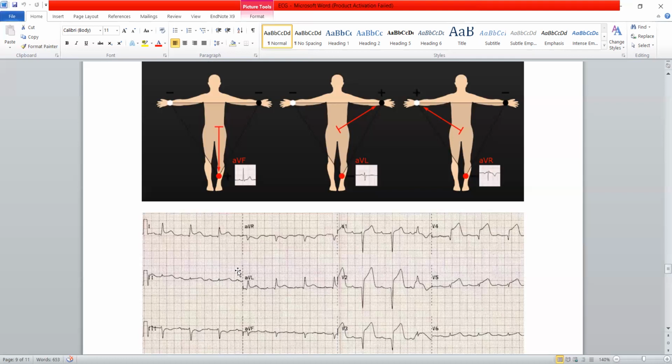Left anterior descending, and left circumflex as well, which are the branches of left coronary artery. So we can say that there is a thrombus in the left main trunk of left coronary artery.